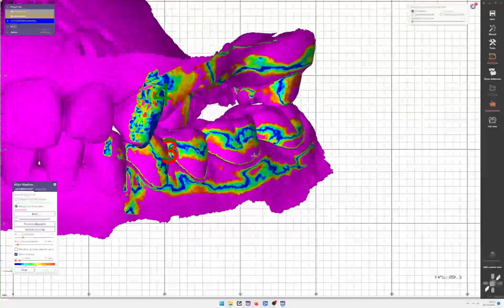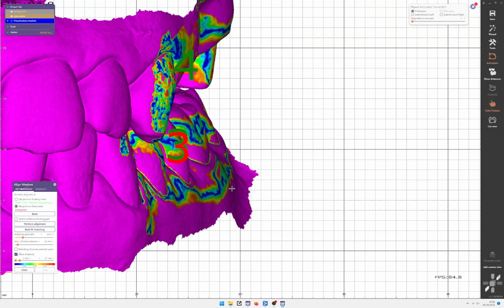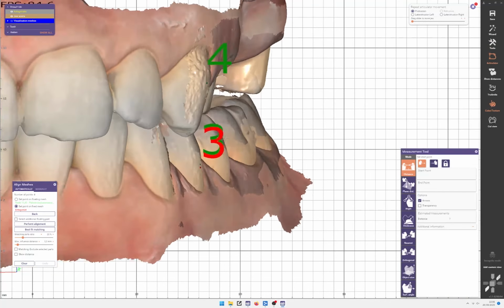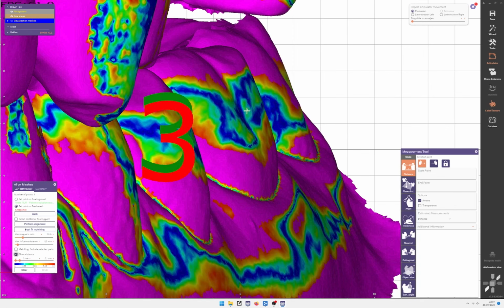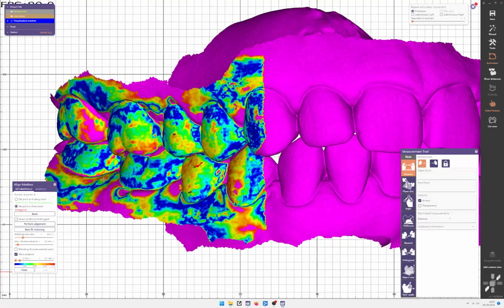They're an indication of a bad alignment, because basically what they're telling you is, if I hide this now and toggle on the measurement tool, your teeth are only matching in a single line where the meshes are intersecting, and below that line, so here and here, the meshes aren't actually aligned well. They're not on top of each other. Here you don't have a line. Here you have a whole surface, a whole region, area of teeth that is dark blue.